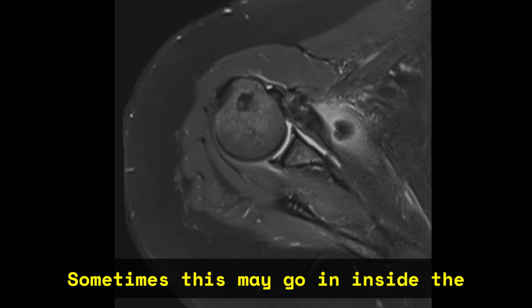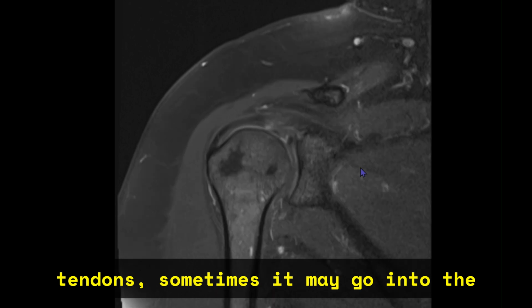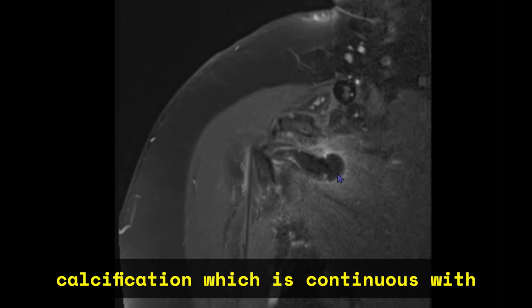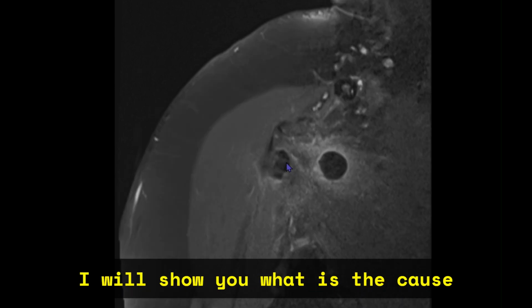Sometimes this may go inside the bone, sometimes inside the tendon, sometimes into the bursa. And so in our case we are seeing in the subscapularis tendon a large chunky, floating type of calcification which is continuous with each other in this region.